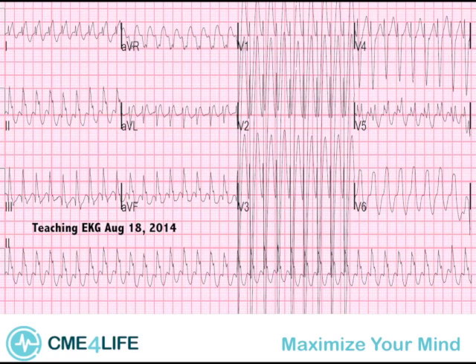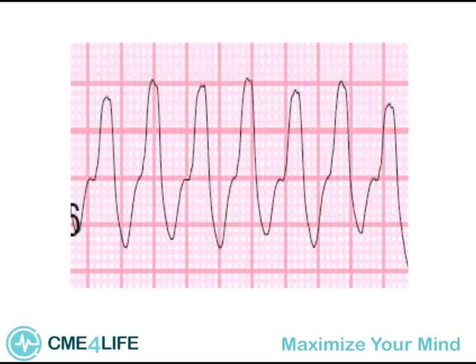He had already received 2 negative chronotropes. He got a beta blocker and calcium channel blocker for what the doc read as a new onset of rapid AFib. He even called cardiology, and one of the key questions here is: is it wide complex or narrow complex? He initially thought this was a narrow complex, and that may have been a little bit concerning, but retrospectively, we don't judge. We're here to learn and to adequately take care of patients, and that can happen at times. But when I look at this rhythm strip, and here's V6, it clearly is a wide rhythm.